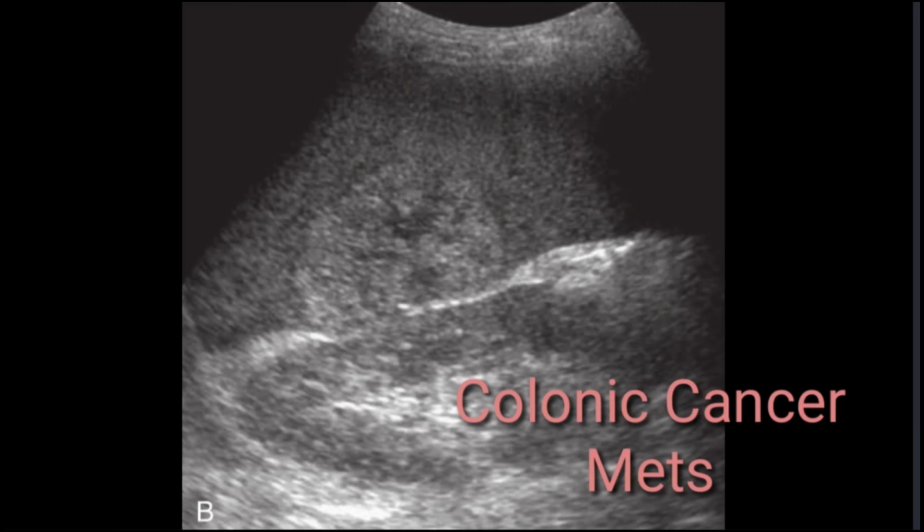Metastases usually appear in numerous or multiple form, but they may likely appear in singular or solitary form. The appearance of this lesion is usually confused with hemangioma, but it is not hemangioma. You can mention giant hemangioma in your differential as well, but you have to mention other likely differentials if you have relevant history and previous investigations of the patient with you.